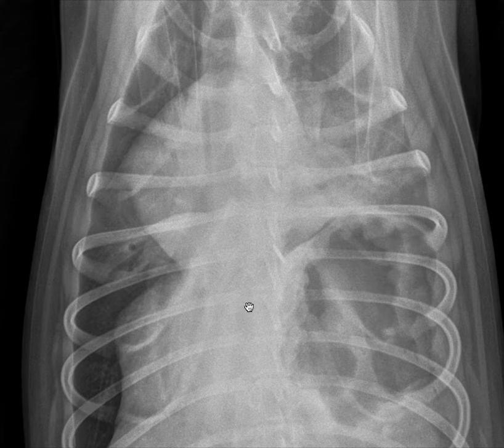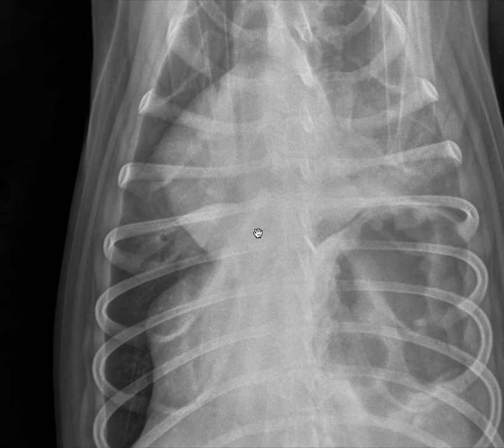Today's example, a 2-year-old Australian Shepherd who was hit by a car. Now, when a patient presents with an emergency situation like this, we are all tempted to abandon our systematic approach and dive right in to look at the abnormalities. For most of our videos, I focus on the important findings. For this video, I will instead walk through my entire approach.